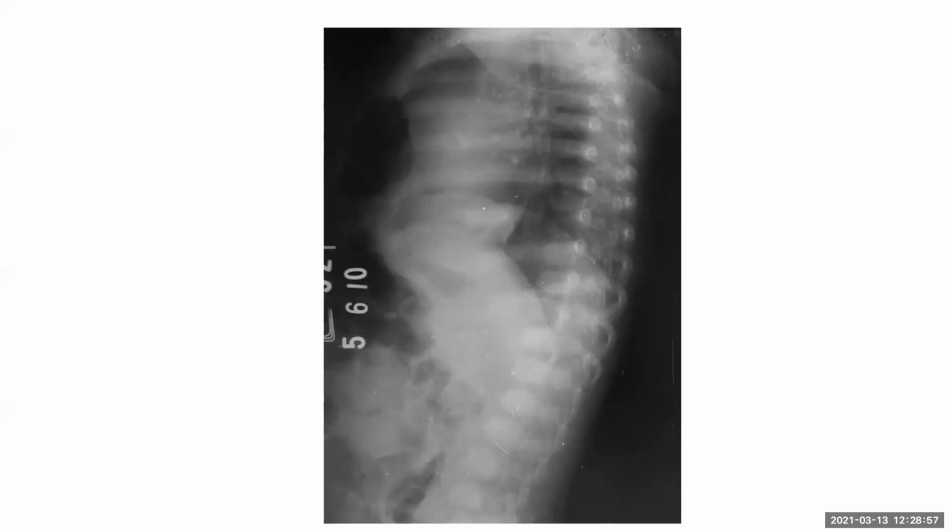Always the simpler things first, right? On the lateral view, I'm able to appreciate the continuity of, anteriorly in the retrosternal area, the gas shadow that is seen extending from the abdomen into the thorax. Posteriorly, the diaphragmatic continuity is maintained. So this is more in keeping with a diaphragmatic hernia, more likely a Morgagni type, which is anterior.